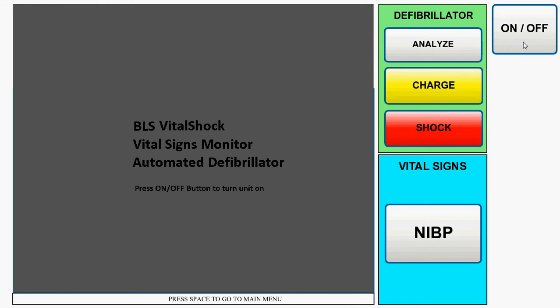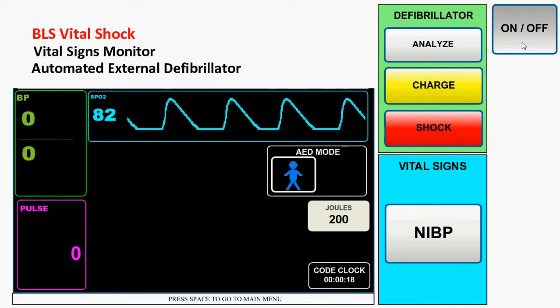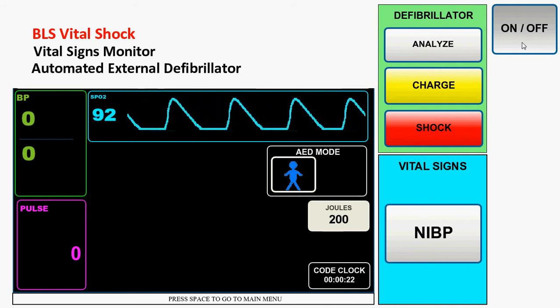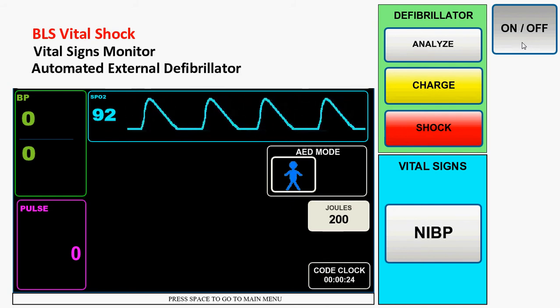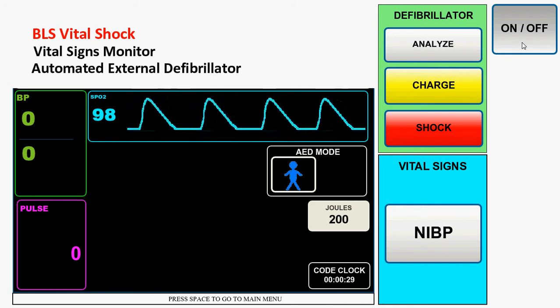They're assessing a patient. They turn the unit on. They're going to see this screen first. And let's say that your student puts a pulse oximeter on the patient. So if some student is playing patient, they take a pulse oximetry lead, they put it on the student's finger, and they see that because you've hit the F as in Frank key on your little keyboard, and the 82% throws up on the screen. So the student next, recognizing this as a problem, puts a non-rebreather on the patient. You can step up their pulse oximetry reading, thusly by just again hitting a couple of keys on the keyboard.